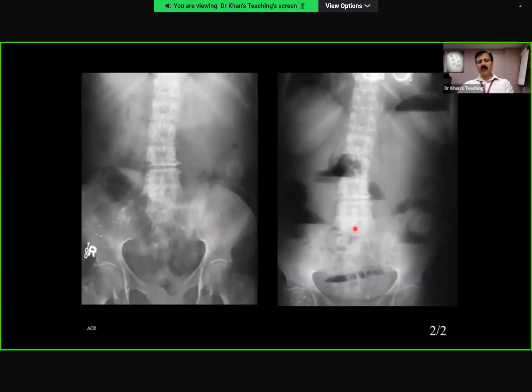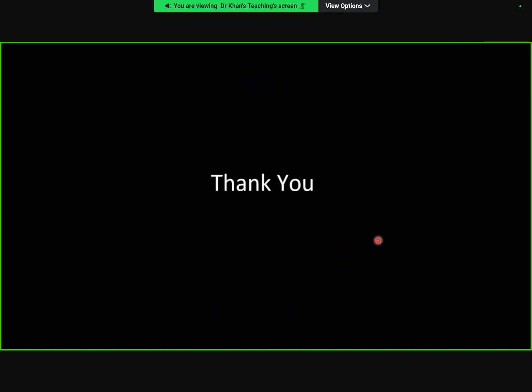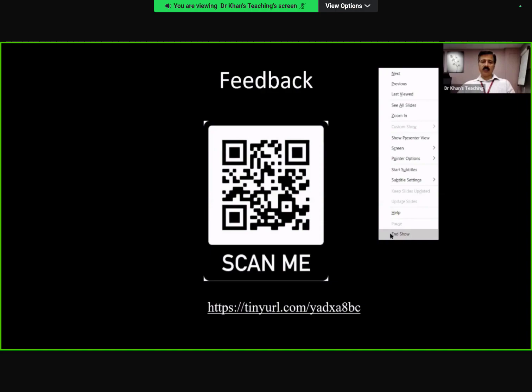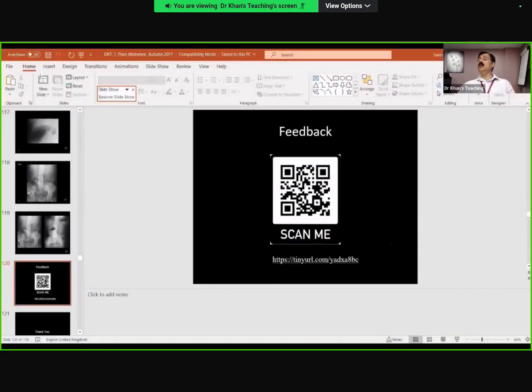Excellent. This is an erect film, which just to develop the same thing, you see this string of bead sign, a string of pearl sign, dilated loops, and this is inside gallstone ileus. So we finish this, and thank you very much, candidate 8, and we are going to candidate 9. I will crack on for the next 5-7 minutes, and then we will give you a break.